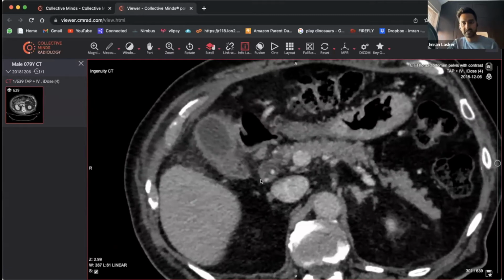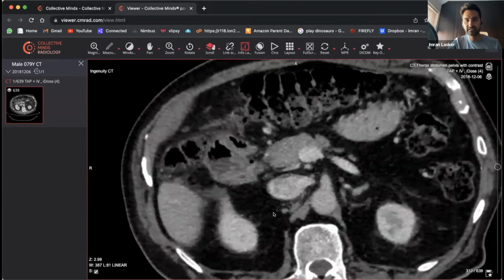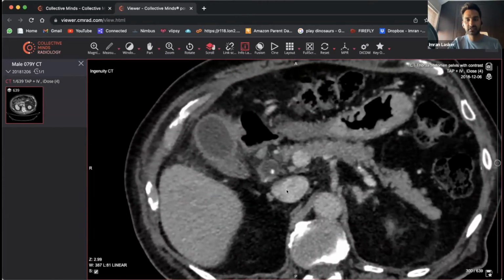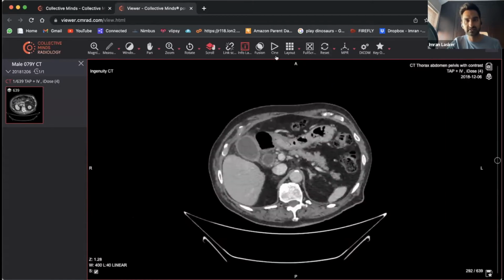And as you come down to the tail, you've got these two hyperdense areas located within the neck, almost going into what is a CBD. And further down, the CBD and everything else looks okay, but there's definitely what looks like a few calculi sitting there. So when you've got calculi sitting there on a background of what looks like an inflamed gallbladder, it's only really going to be one thing. It's going to be cholecystitis, right?